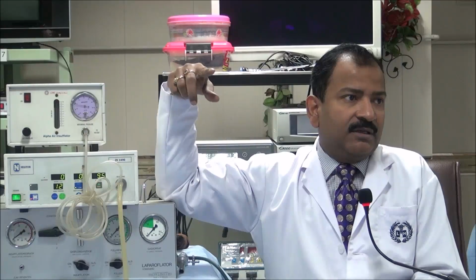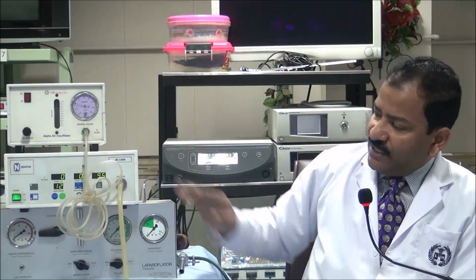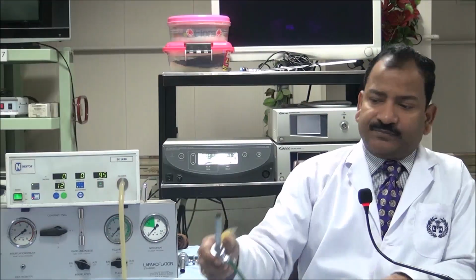It should be used only if, suppose, 90% of the cholecystectomy is done and the cylinder is now empty. In those situations, why convert? Use room air. And it is not that you cannot use energy in room air. You can use energy, just like in open surgery, where you are using cautery. So using energy with air is not a problem. Using energy with nitrous is a problem. If you are using nitrous, you cannot use bipolar or monopolar. But with air, it is okay. You can use it. So this way, you have to decide the insufflation.